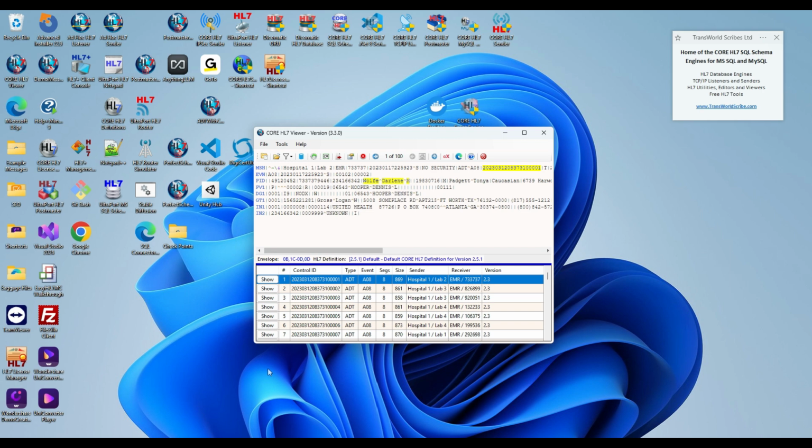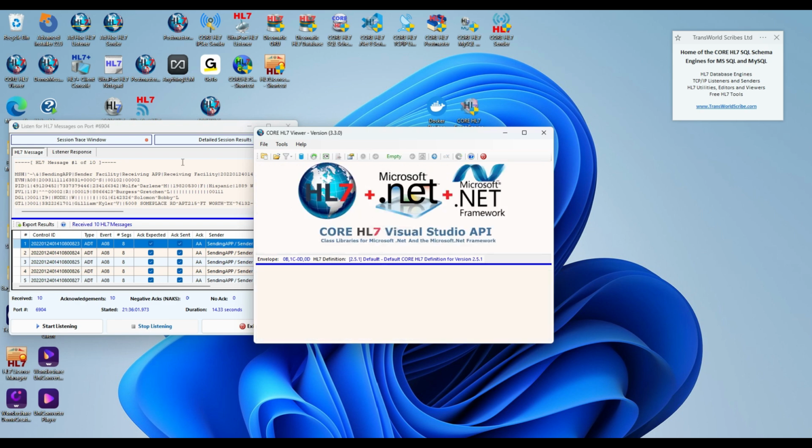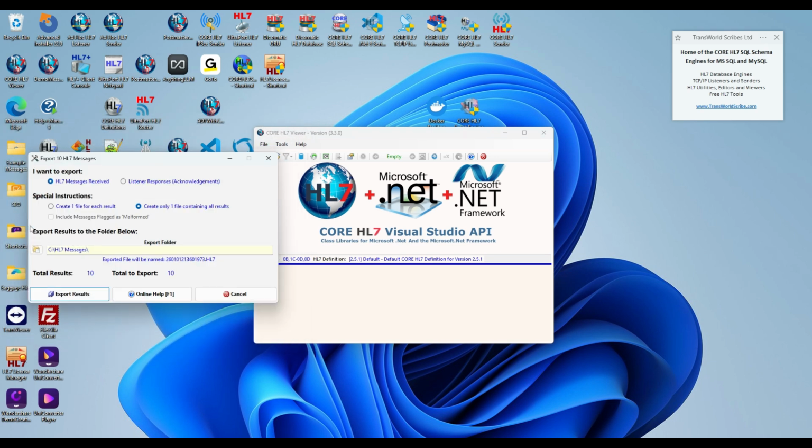Now that's very cool. Let's go to, for instance, the listener that we just did. Remember that? Where we received the message? So let's bring that back up. These are our results that we had. What I want to do is bring them up in the viewer. So I'm going to clear this out. Just cleared it out. Here's my message. I say I want to export the results. And it says I want to export the messages. I want to create one file, and I want to put it in this folder.